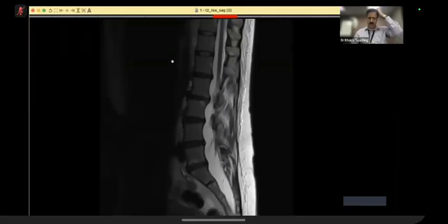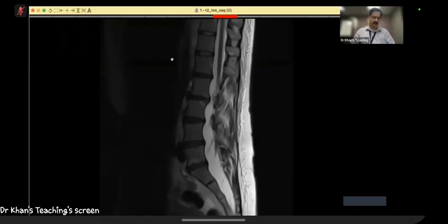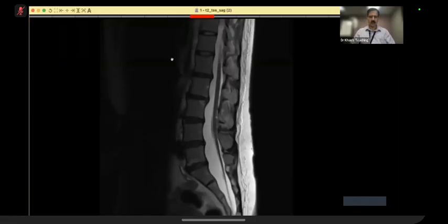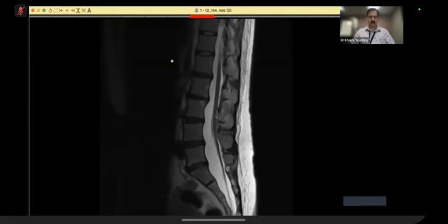Okay, so there is need for screening as well. Sorry. The patient is symptomatic. I told you it's a 38-year-old, leg weakness, bladder dysfunction. Why is the patient symptomatic? What do you see on this scan which can explain the symptoms?